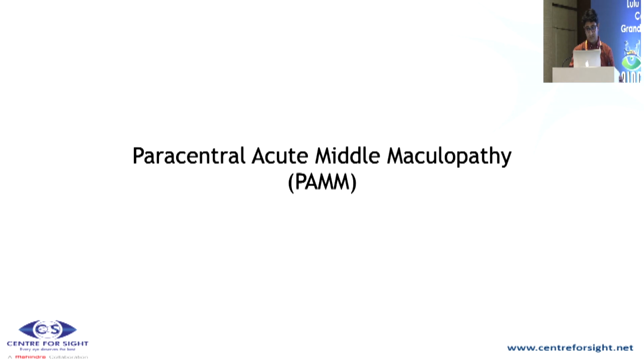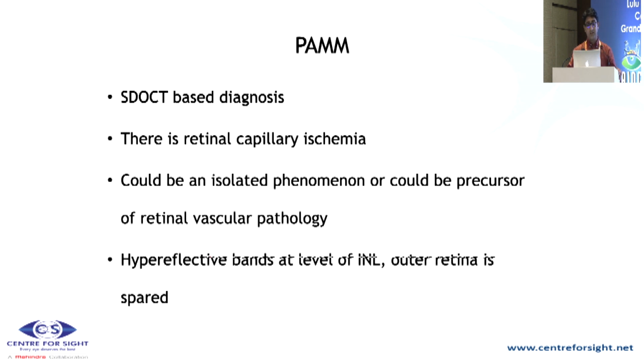And an entity which I'm going to cover is PAM, which is paracentral acute middle maculopathy. It is a diagnosis which has been proposed on SD-OCT. On SD-OCT, there is retinal capillary non-perfusion ischemia, and it could be a precursor to maybe a CRAO or a CRVO.